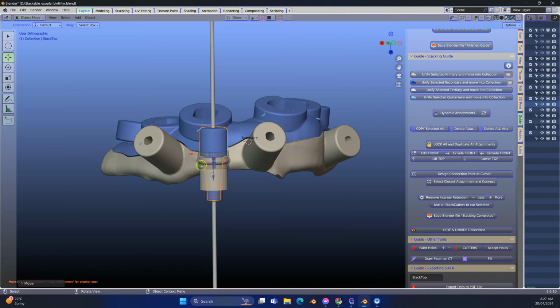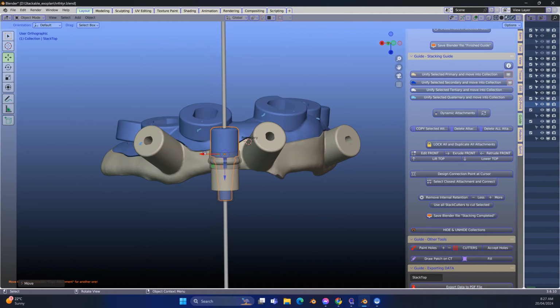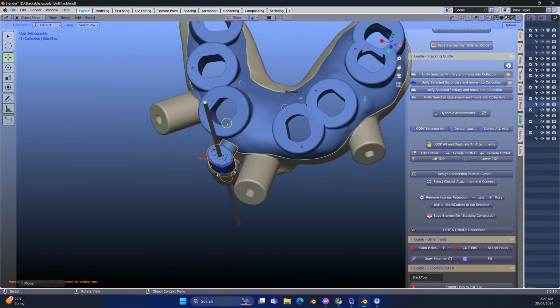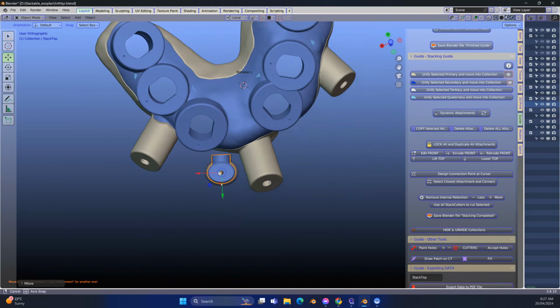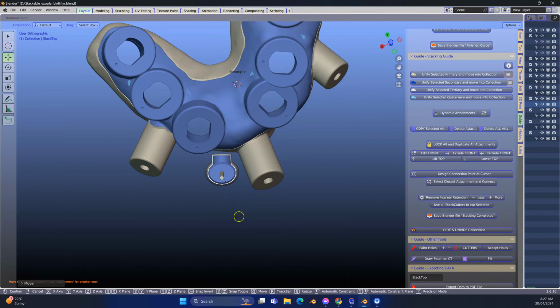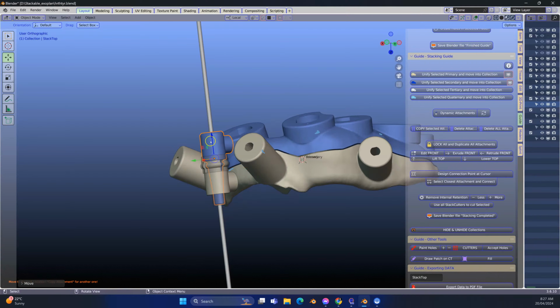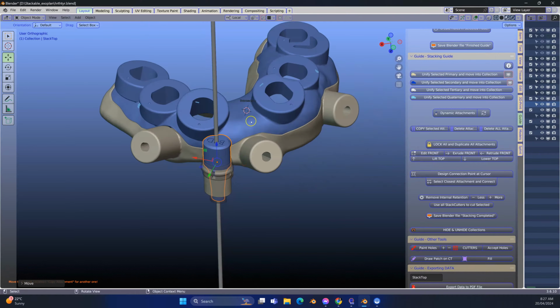Okay, so here I'm going to sort of set the scene for my first one. We're going to bring this back. I'm going to put this to local, then it's in the X and Y and Z is in the local coordination. I'm going to rotate this a bit, and hopefully I can stick it on over here. So I'll bring this out a little bit and up a bit like this, so that we can attach it over there and over here.